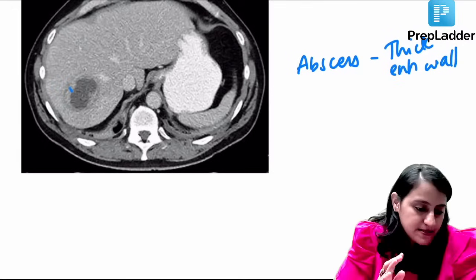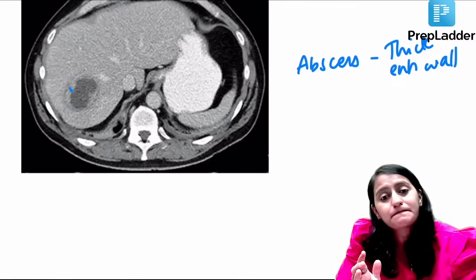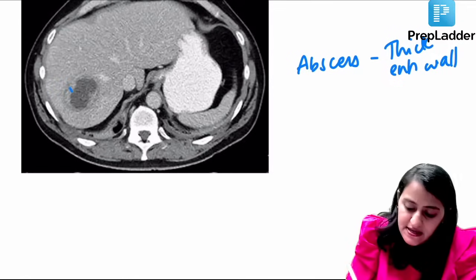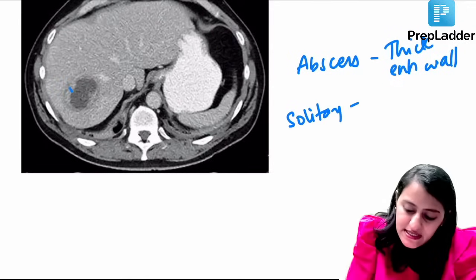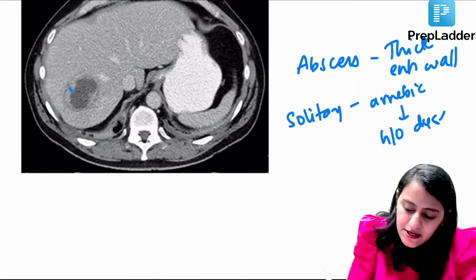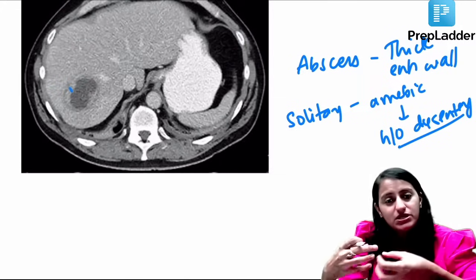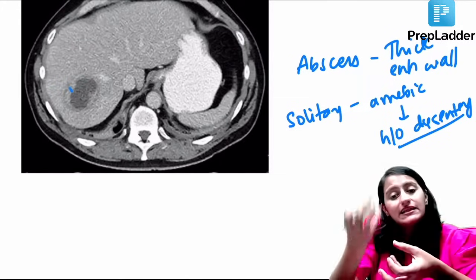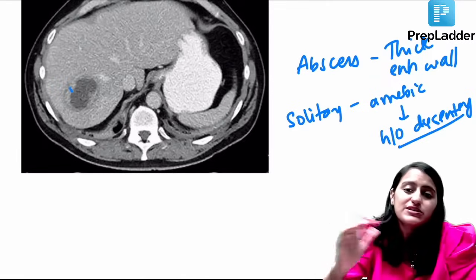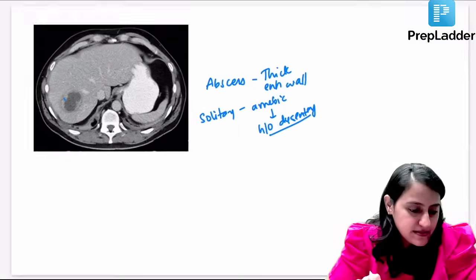It's an abscess. Amoebic liver abscess versus pyogenic liver abscess. Generally, if it is solitary, it is amoebic liver abscess, and in amoebic liver abscess, you will have history of dysentery as well, right? Because first comes the dysentery, the Entamoeba histolytica, then it invades the liver, right? So if there is a liver lesion after dysentery, then you think of amoebic liver abscess. Okay.